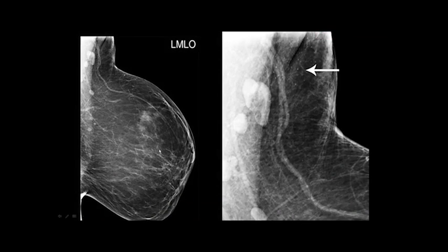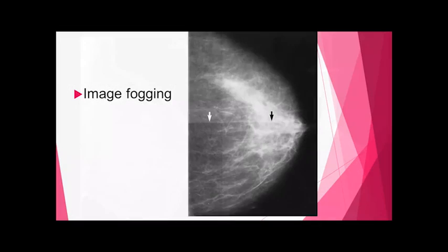So you see this image here. It's not bad. Nipple you can't see. There's no nipple marker. The bottom of the breast is cut off because she's very, very large, even for the large detector. So you don't want to send in mosaic imaging. But I'm just showing you this image because you really don't see anything here. But when you zoom in on it with your zoom factor, look, there's tiny, tiny pieces of deodorant because it has zinc and aluminum in it that can show up on x-rays.